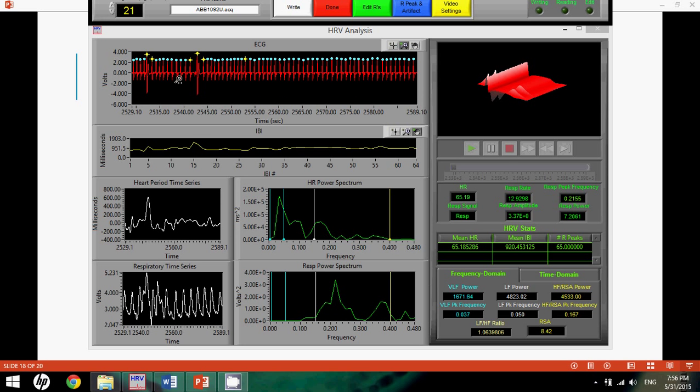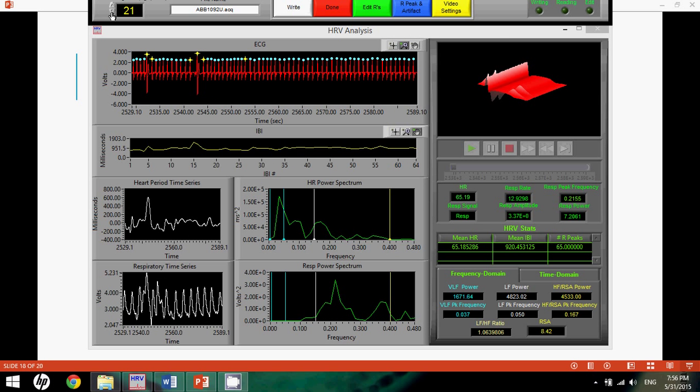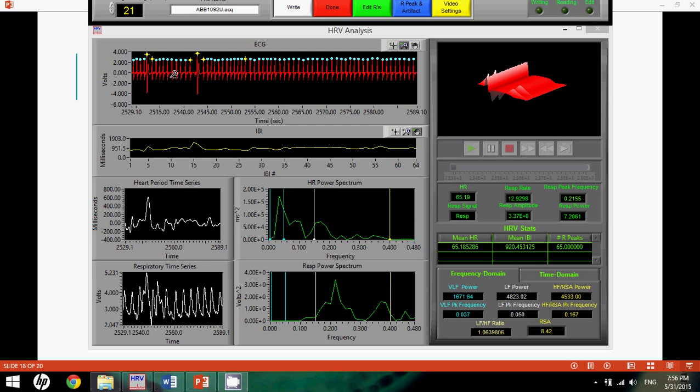However, in this case, we see examples where there's a clear drastic increase in the signal, and we don't know if we'll be able to keep it or not. You can also tell this is the case because in segment 20, where we don't have any real issues, we see our RSA at 7. When we go to the next screen, we see that because of these two anomalies, our RSA jumps up almost 1.5 points. That's a huge increase in RSA.